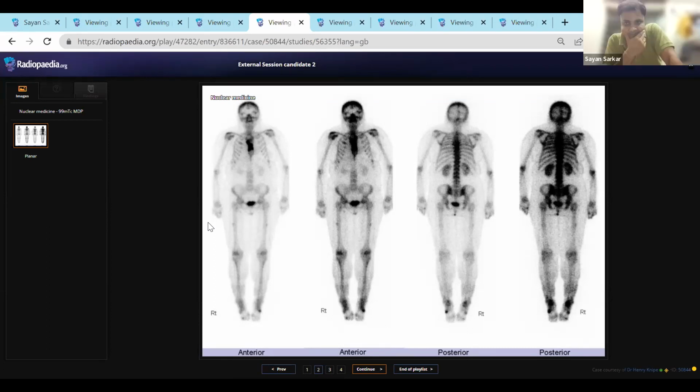Actually, in the bilateral femora, I can see spot increased uptake along the lateral aspect in all images. It has a very uniform appearance. What do you think they are? They are cortical based, so they could also be metastases.